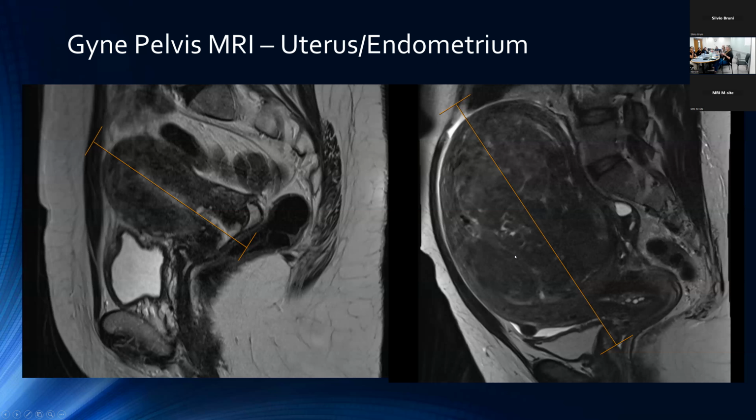On the right, a large uterine fibroid, this heterogeneous T2 hypointense fibroid, is completely distorting the normal zonal anatomy, anteriorly displacing and compressing the endometrium, which you can see maybe a small portion of it here, more inferiorly, but for the most part, you really lose that zonal anatomy. It's hard to use the endometrium itself to draw your planning line, but here you would again essentially draw a line approximating the center of the uterus itself, again making sure that coverage extends a couple of centimeters above and below the uterus and cervix.